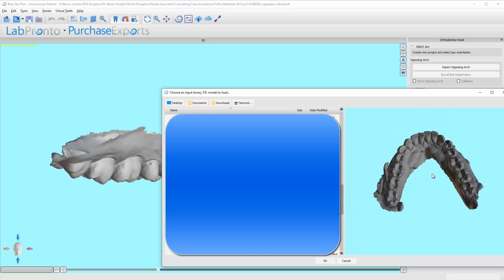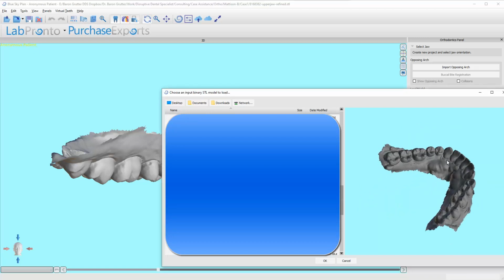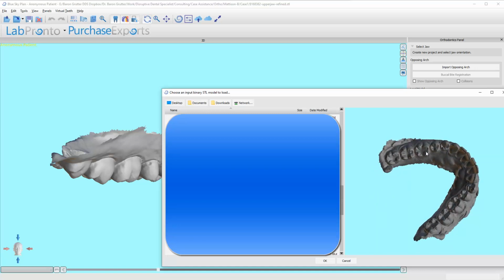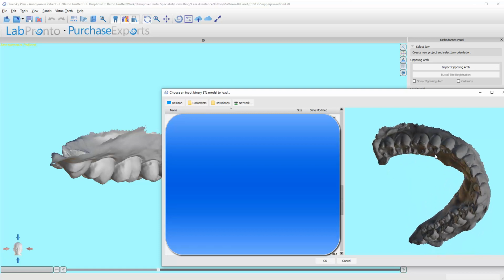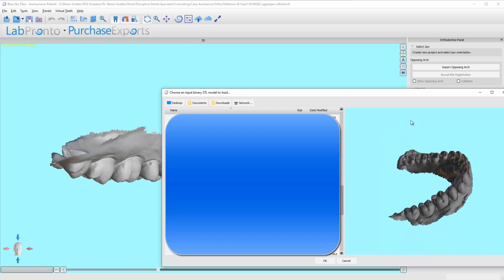So I'm going to go ahead and just pause for a second. All right, so I've now created a new model, and here it is. I literally just opened this up in Mesh Mixer, deleted that spot, and moved on. I don't care about any of the other stuff. I think I can work with just about everything else.